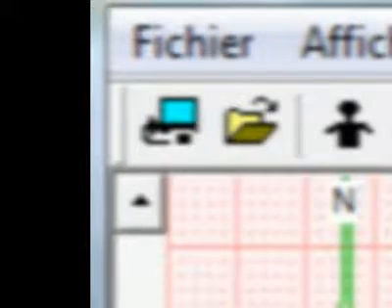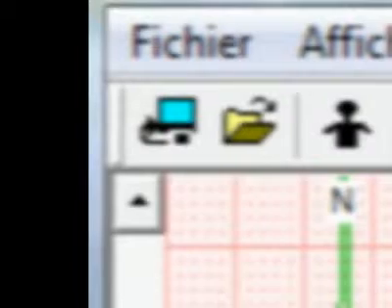Icon: transfer data recordings from AFT to PC. This operation can be done after connecting the AFT recorder to the PC. There are more details of this in the video, Analyze a Holter Recording.